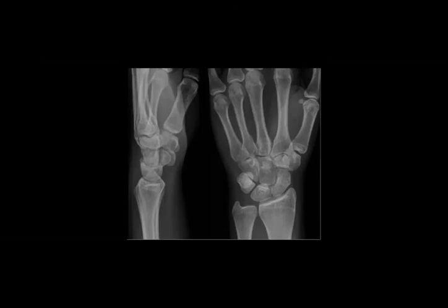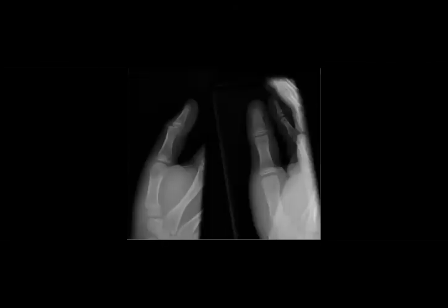When you go to the wrist, you will check for example the dislocation, lunate, scaphoid fractures, and what would you like to look for in the lateral? Triquetral fracture. Perfect, Ale. It's not an easy one, but always look for triquetral fracture.